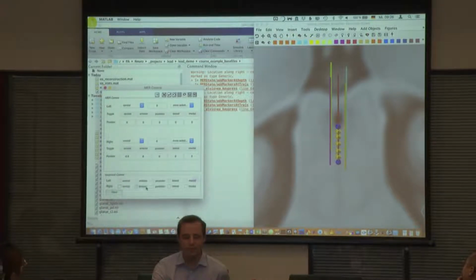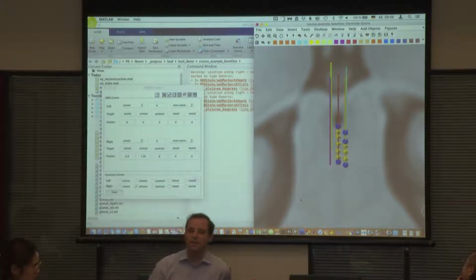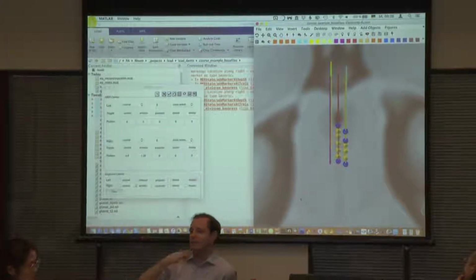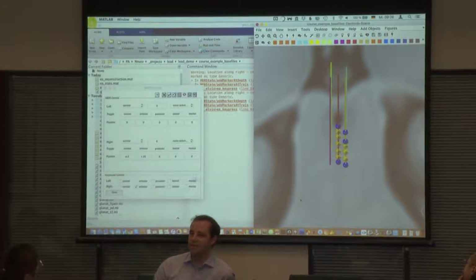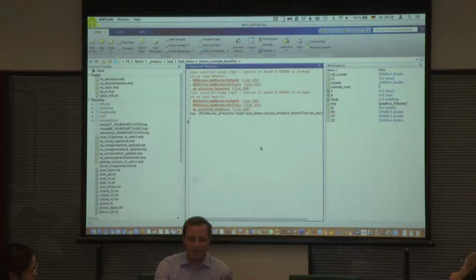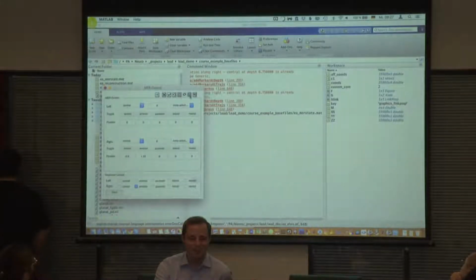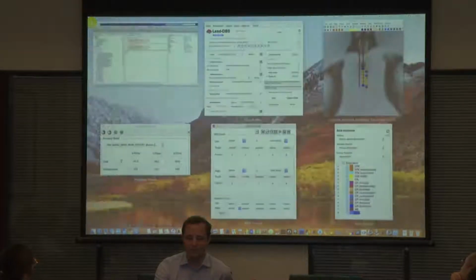So of course we can now say we switch to anterior, and we move the other electrode. We say the top was here, and then we had some cells here, and then the bottom maybe was here. That way you can mark the electrophysiological borders of the STN. And you can store this data with this button here, save state, and then also load state. It's saved in this file, and I think if you just load it, it will load the one that you saved before.